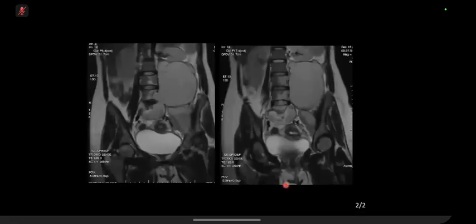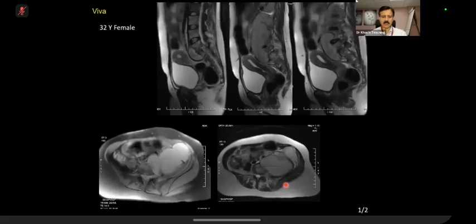This is a very simple case. Anybody will pick it up. I just wanted to make a point here. Psoas sepsis has come in the exam and it will come again. TB, for example. I've got very good cases for psoas sepsis that are more subtle.